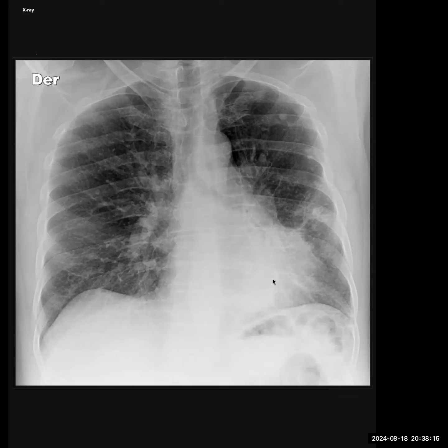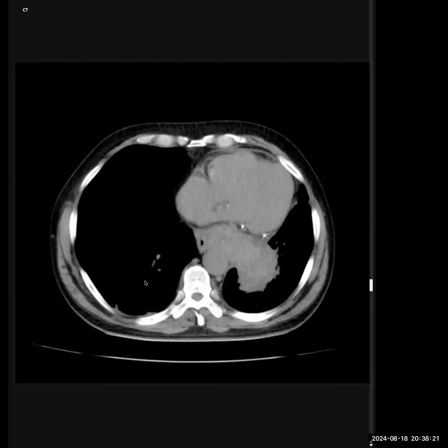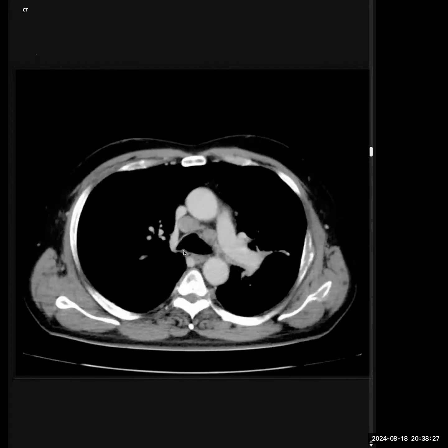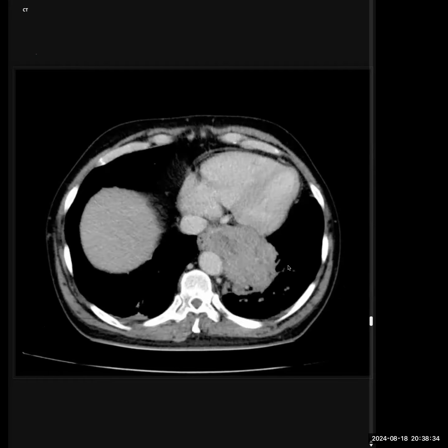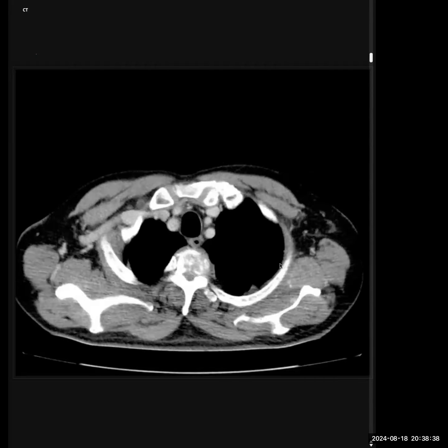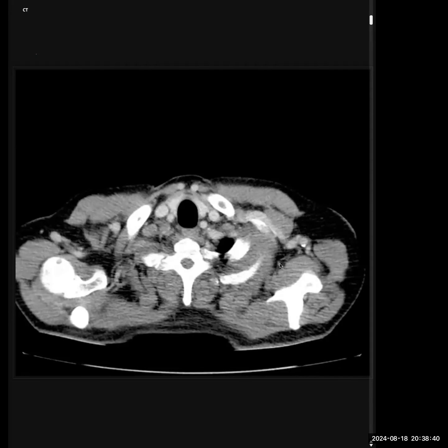So when you see these nodules and this lesion, you should be thinking about a mass lesion, a lung cancer. Although we didn't go to the contrast images, that doesn't really add a lot, except that you can describe the heterogeneous enhancement, some necrotic areas, and you did find the rib metastasis as well. So this is a lung cancer with bony metastasis.